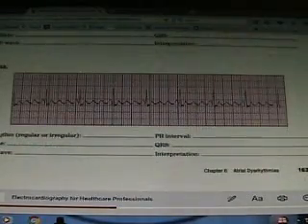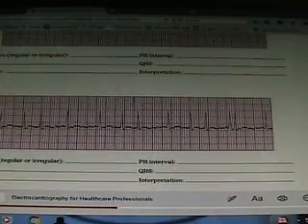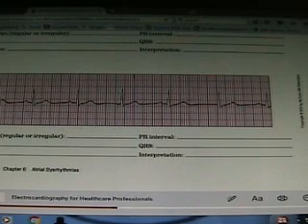Because if your patient is AFib, is another AFib, okay, this one, it's not fast, so it can't be MAT, so I look at the P waves. That one looks normal, that one looks normal, oh, this one looks crazy, that one looks crazy, this one's missing. This one's so far away. Look how far away it is, versus how much closer it is here. Here's about 3 little boxes. Here's about what? 1, 2, 3, almost 4.